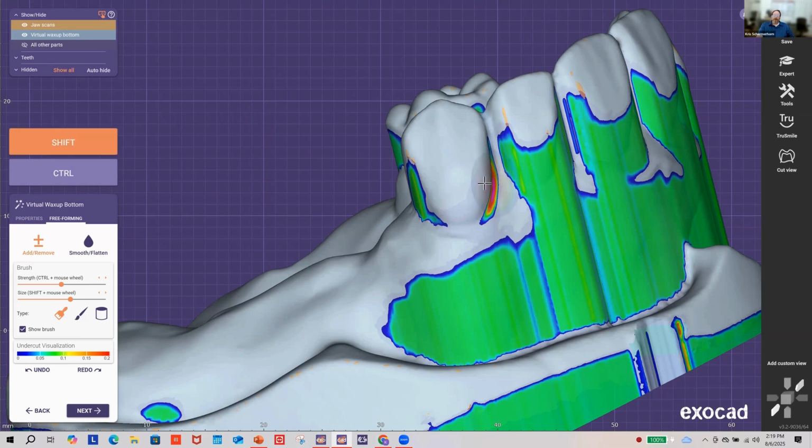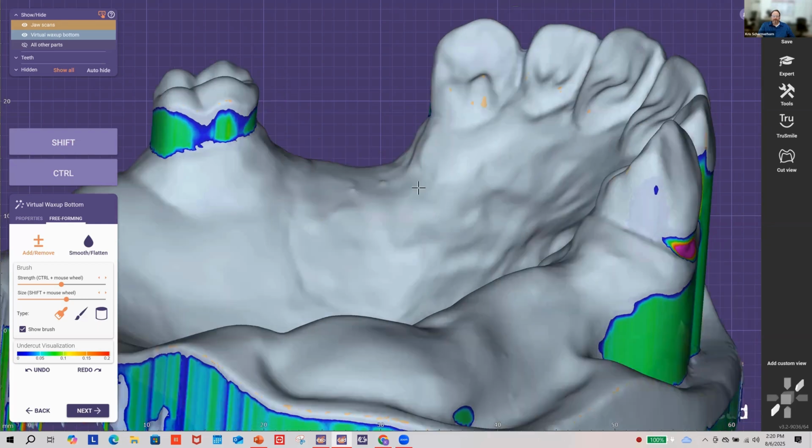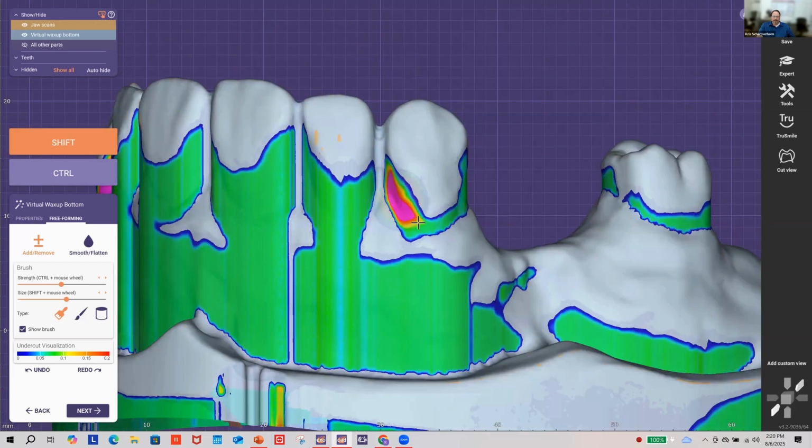All right. Like I said, 95% of the time, the tips of the clasp are going to go into the deepest undercut. Right. Here's where you want to worry. Now, this is a free end, so the partial will flex back and into place, but generally you'd want to add here and take away any undercut so that you have a clean path of insertion. Over here, I'm going to hit my shift and I'm going to remove the undercut, right, to expose more undercut.